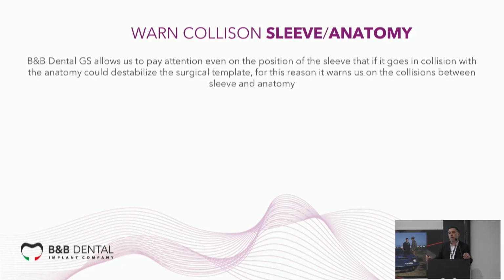But in case the sleeve goes in collision, half a millimeter is not a problem. 1 millimeter is not a problem. 1.5 millimeters is not a great problem. 2 millimeters is a big problem. So in this case, you have to move up the sleeve, in position +2.